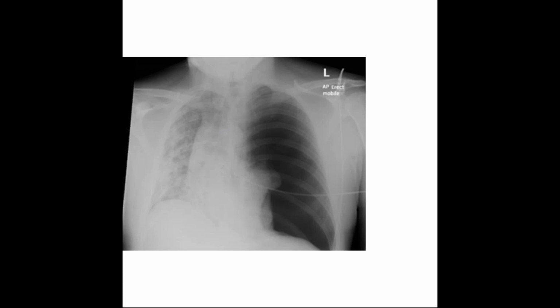Right lung fibrosis. Again, I am requesting you, especially at your learning age, you should not jump to the diagnosis. This is the way you present in the exam as well. Whenever you are put forward an X-ray in your table vivas or grand vivas, don't just see the X-ray and tell the diagnosis.